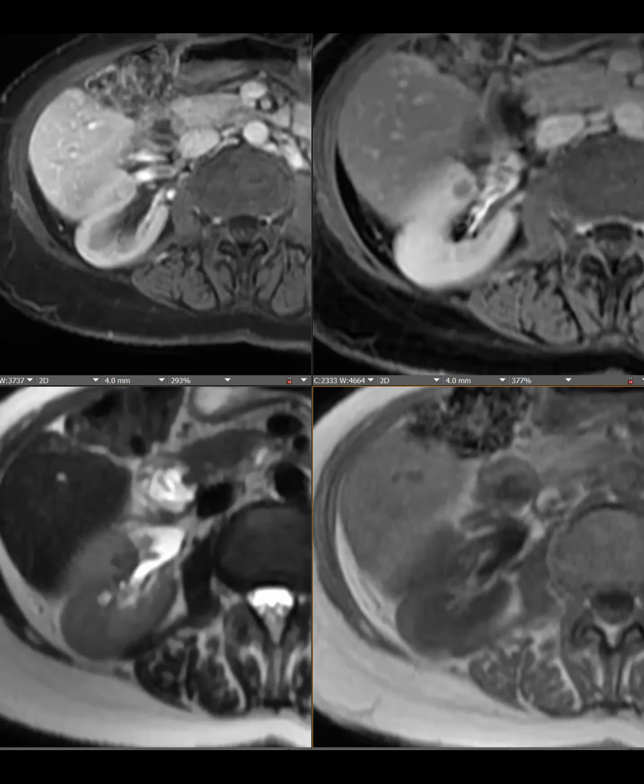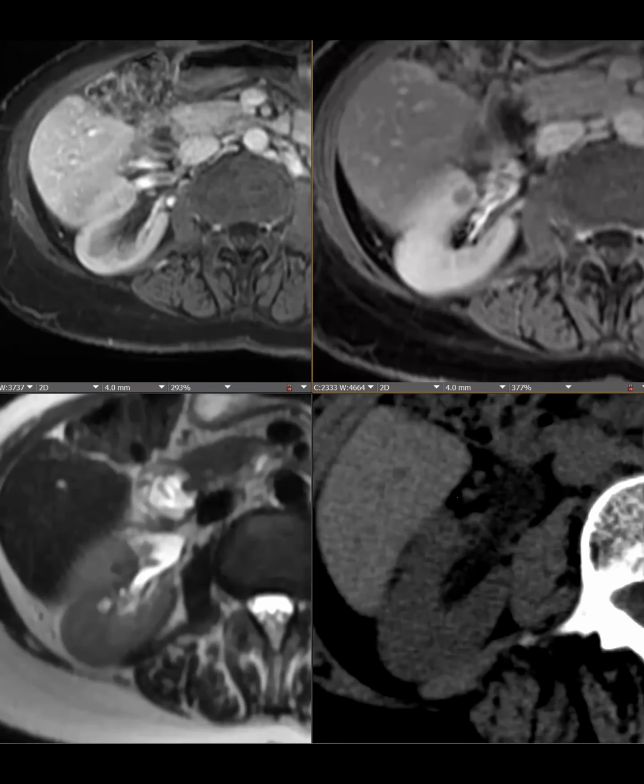It's a small lesion. On the CT, let me pause it so I can drag my... Okay. Could it be a lipid poor AML? Yeah, right, exactly. This is a non-con CT, and we only have a non-con CT, but this was from a few years ago, and it's stable in size, and I thought this was slightly hyperdense, more dense. Right? Yeah. I thought this was a dense lesion.